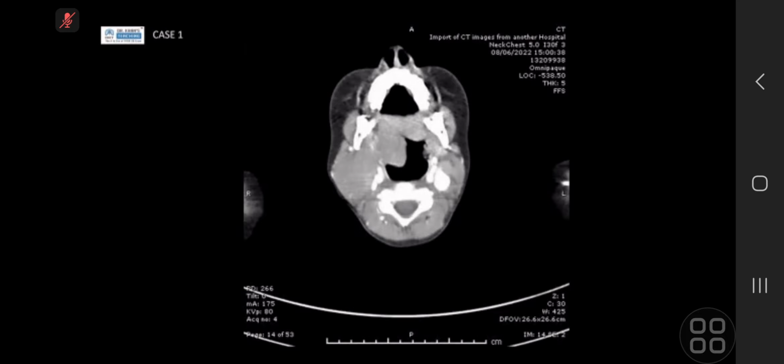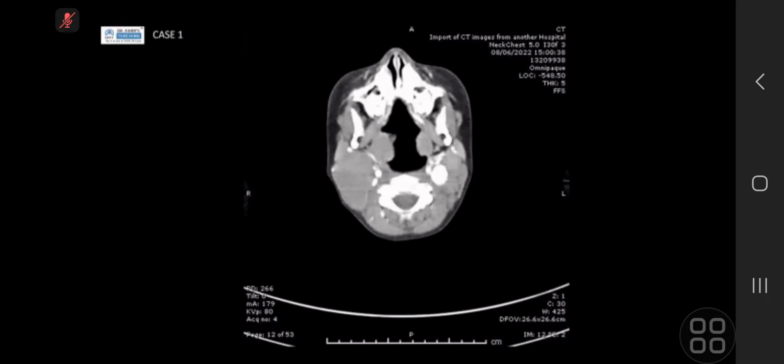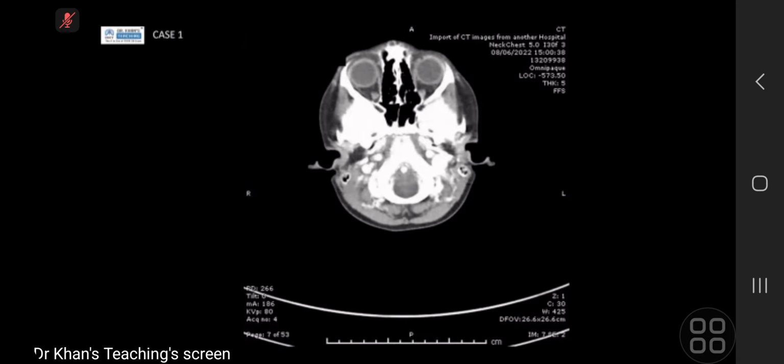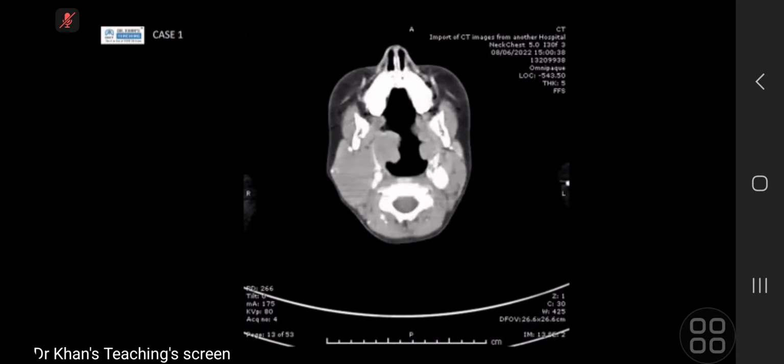Okay. So I have two candidates. Could I have candidate 1? Can you say hello if you're there? Hello. Good evening, Doctor. Yes, I'm ready. Would you be a bit louder? I think you're a bit soft on my side. Okay, hearing you well. Yes. Well, this is a CT study of. Just once again, I'm going to scroll because this is a slide deck. Okay, so I'm scrolling, and I'm going back.